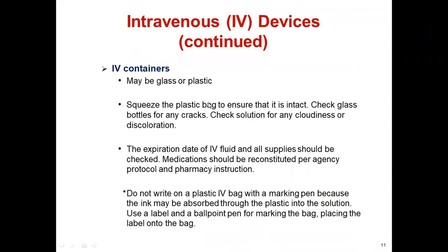Squeeze the plastic bag to ensure that it is intact. Check the glass bottle for any cracks, and check the solution for any cloudiness or discoloration. The expiration date of the IV fluid and all supplies should be checked. Medication should be reconstituted per agency protocol and pharmacy instruction.